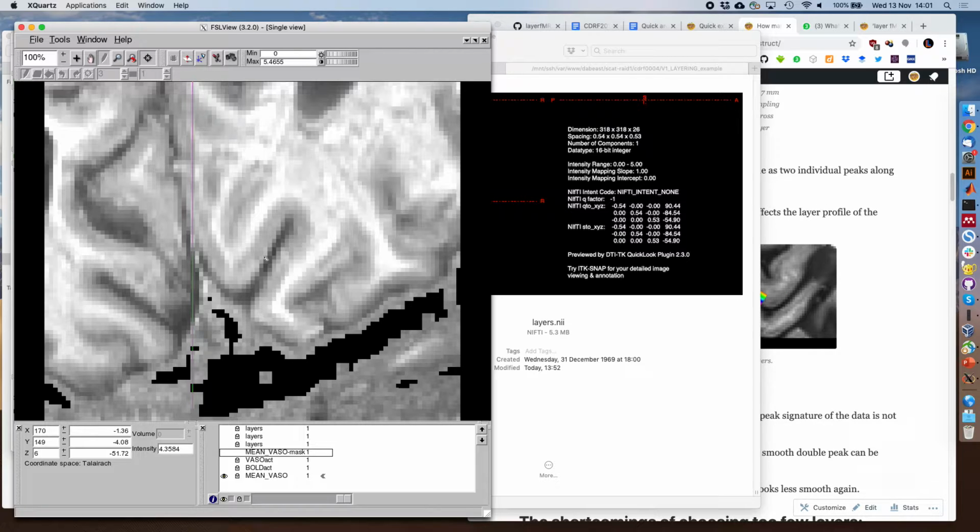I usually try to be very conservative in the sense that when I draw my rim mask, maybe I can remove the inner so you see it better. I try to not really draw it at the borderline between gray matter and white matter, but more at the white matter. So for example, like here, if you see it, I kind of make it the upper layer of white matter. So I always try to be more inclusive and then cut it later in the profiles.